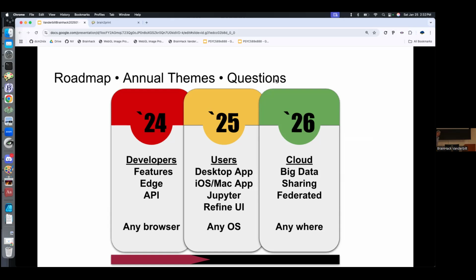I would say you can use this however you want. If you want to use it as a desktop app, you can go to the Apple Mac Store, the app stores, you can get it as a desktop app. If you want a zero footprint tool that you just download and drop things on, you can do that. We have desktop apps, but also if you use BrainLife and other things, we also will have it on the cloud stack.